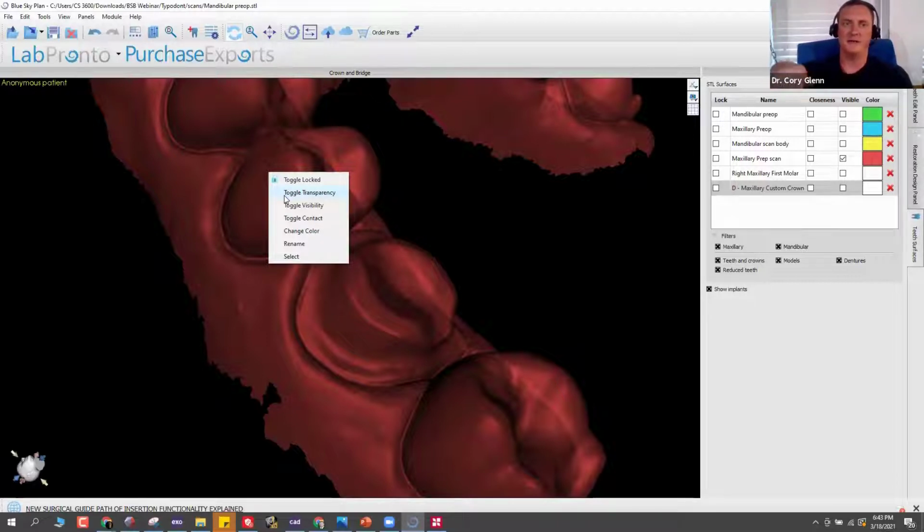You've usually got anterior teeth that are inclined, plus a labial fold that's kind of hiding them. And so usually a desktop scanner, if you're just scanning an impression, is going to miss the lingual areas of those teeth. Same with really long teeth. It's trying to get the scanning light down into a deep dark hole, and so it might not be able to. But again, for posterior teeth and for triple trays where everything is oriented straight up and down and it's not that deep, I've actually never had a failure on a triple tray that I can recall. So it really is an easy process for your single tooth day-to-day crowns.